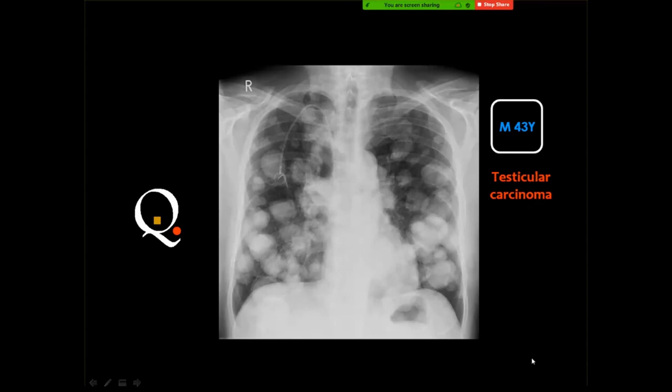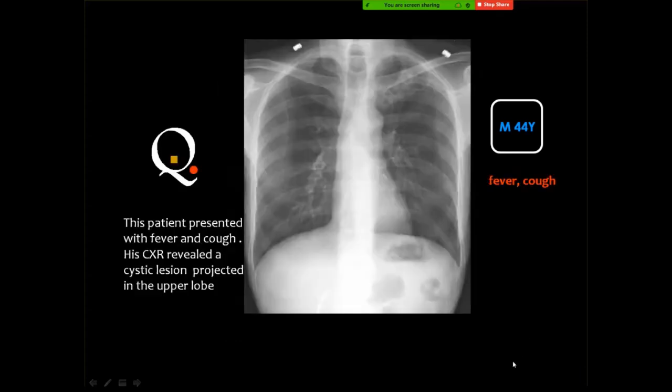Metastasis. Cannonball metastatic deposits. Sometimes they do not provide this history, but the presence of the central venous line, which is usually used for chemotherapy administration, is sometimes a clue for the history.